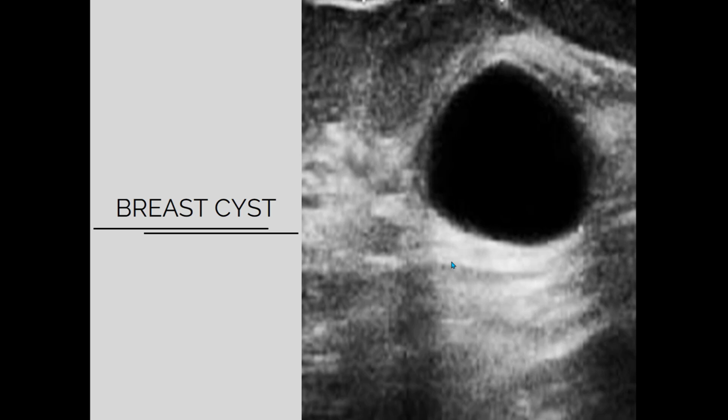I can say yes, I can see an anechoic lesion, a well circumscribed anechoic lesion, but I cannot say which part it is. So in that case we tell you some scenario so that you can understand which part it is. We are not asking you which part it is, because it's really difficult to understand. So don't worry.